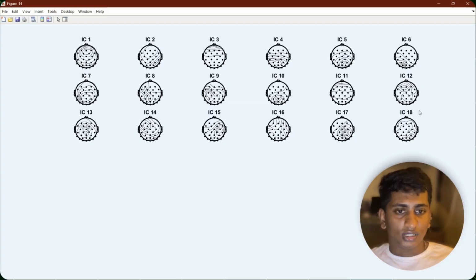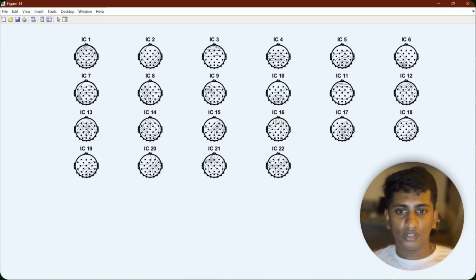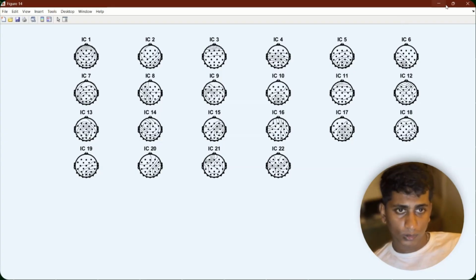Before that, we'll be seeing the 3D and 2D modeling of the scalps. So you can see here how it is forming the waves and all the generated things after the processing of removing noise and all these things. So you can see the clear picture of how the signal is traveling in each and every node or electrode. Let it load. We'll also run the 3D mapping of this.